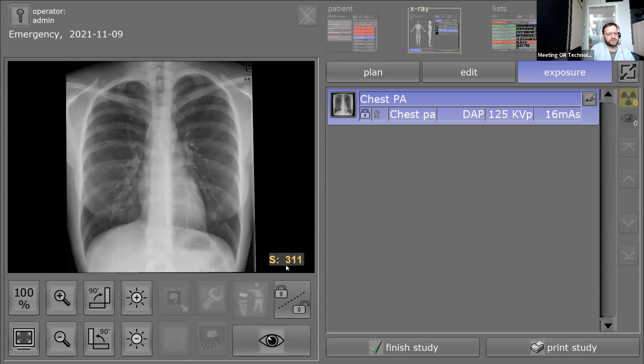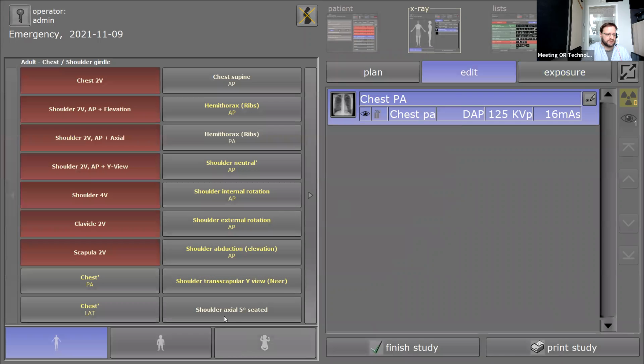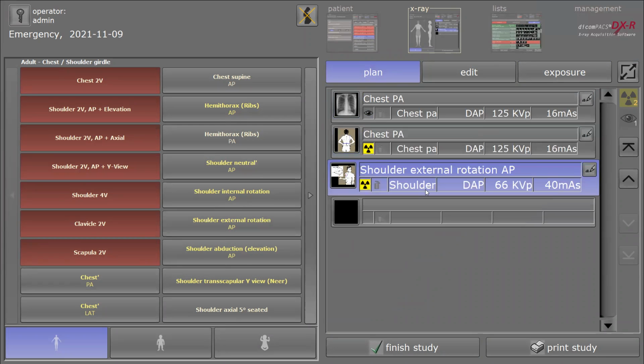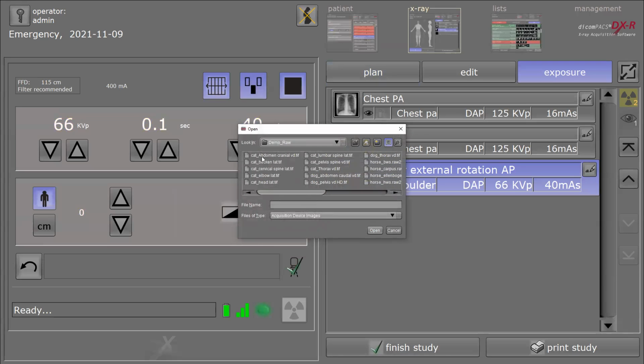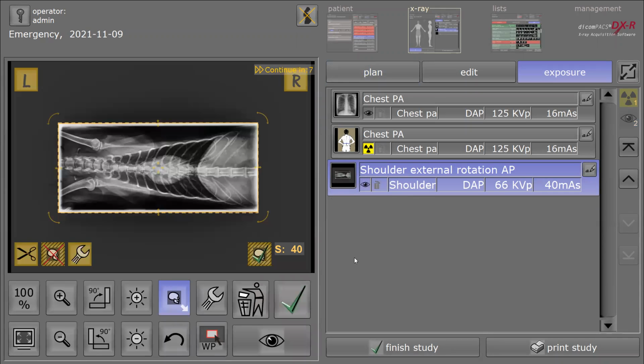Let's check out maybe. One moment, please. Because it's a demo system, it's a little bit different. Okay.